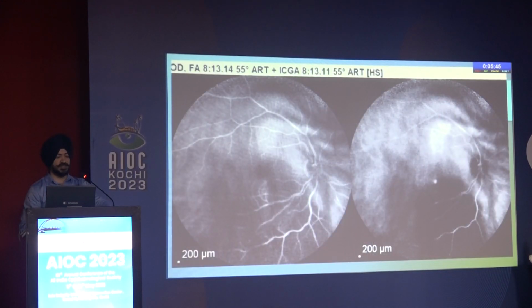This patient actually presented with a diagnosis of choroidal melanoma with a large elevation in the lower part of the retina with macula involved, and a simple test with ICG picked up a polyp. It was a case of PCV with intense subretinal bleed, hematoma, and we just did the focal laser for this leak and the patient recovered 6/6 vision.